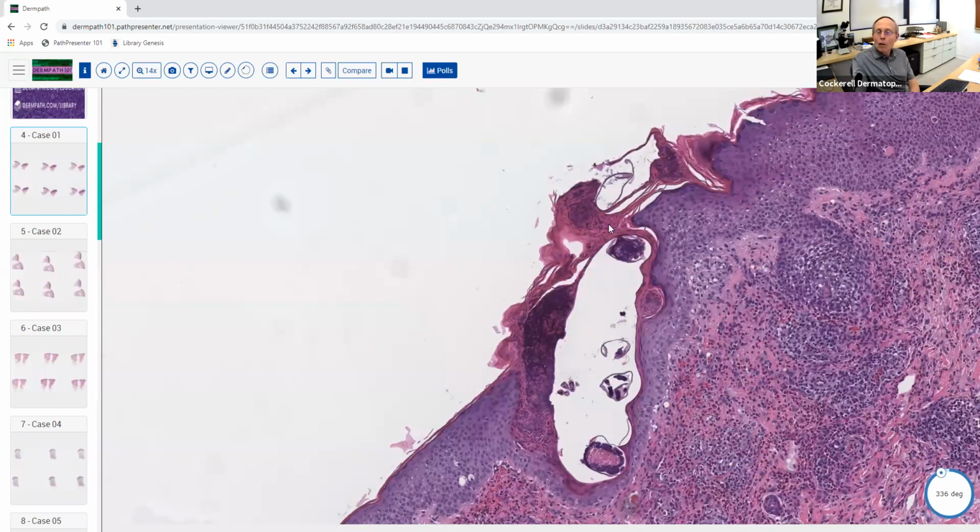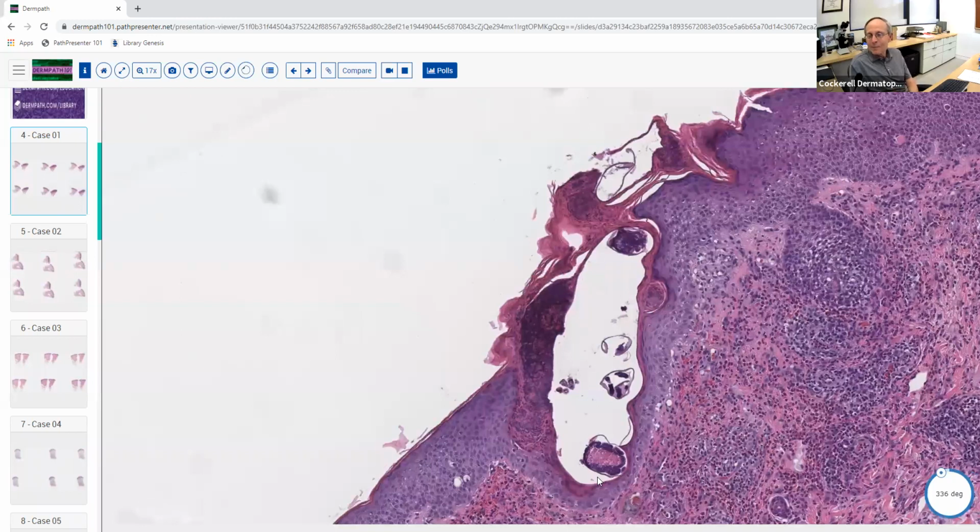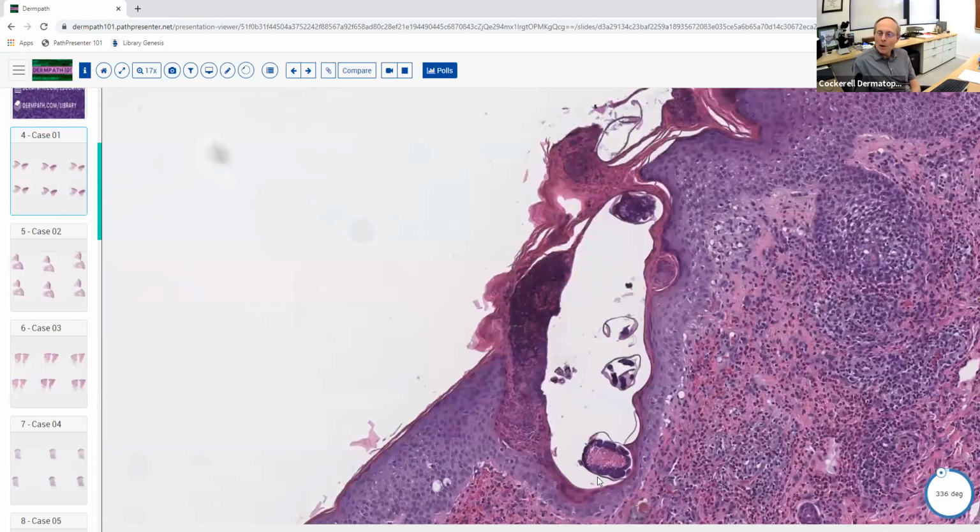And what do you call this little dwelling where the organisms like to live in scabies? Would this be an intraepidermal vesicle? Yeah, but it's got a specific name to it. And you've probably heard it. Like the burrow? A burrow. Yeah, a burrow. So the organism actually is tunneling through the skin. So this is a burrow.